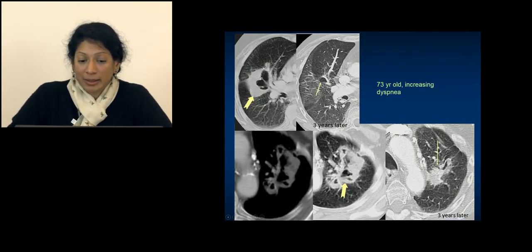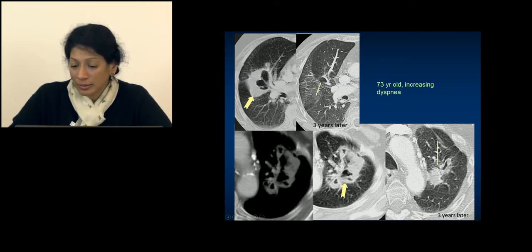So we had an elderly patient with these nodules, first on the right lung with this thick wall thickness here, intermediate wall thickness here, and cavitation in the center. And 3 years later, there was just a small cyst which was left. Her changes on the left side were also quite large, with cavitations here, and after 3 years there was still a residual nodule and some cystic changes here. So they do resolve over time.